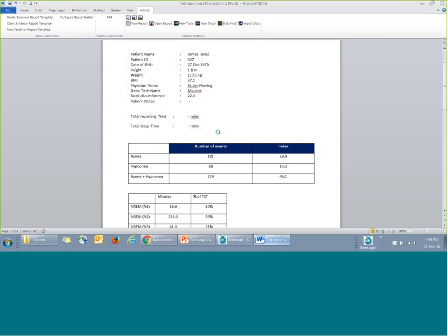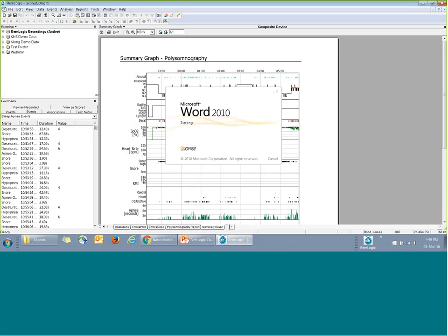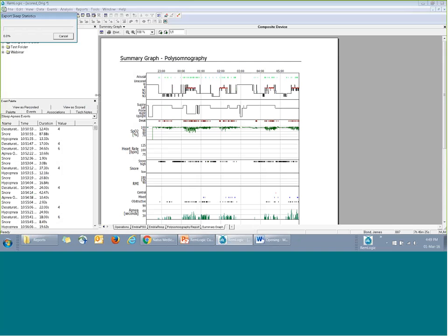Oh, okay. So this is what I mean. I replaced my own template, or my working template, with the format that I did just now. So I'm going to show you what happens if I generate a report. Bear in mind that this is a common mistake that a lot of people make. So this is a perfect example to show you how it looks.